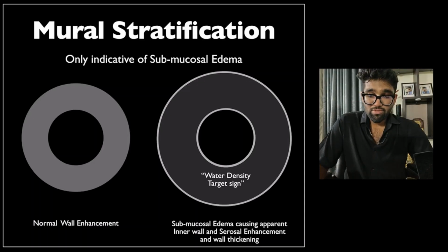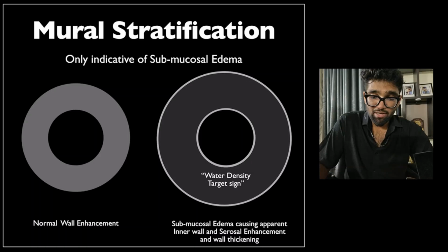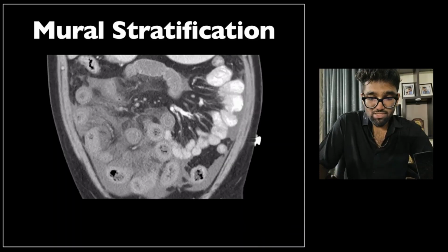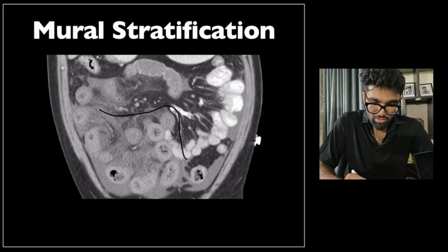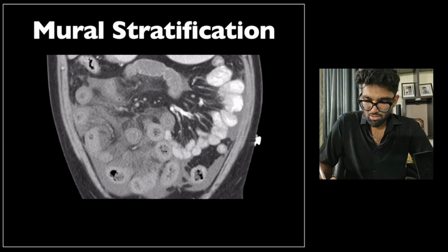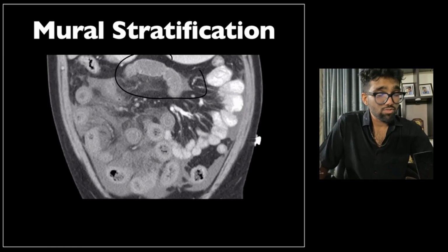Okay, so edema could happen due to capillary leak due to anything. It could happen due to angioedema. It could happen due to inflammation related capillary leak. It could be related to your submucosal vasculitis related vessel inflammation, luminal inflammation, and then secondary capillary leak. So it could be all three. So coming back to the image that we had started with earlier. So again, like I said, parts of the jejunum were affected. A lot of the ileum was affected, and it was almost extending into the colon, possibly also. That was why we had seen that there was a possibility of acute mesenteric ischemia.